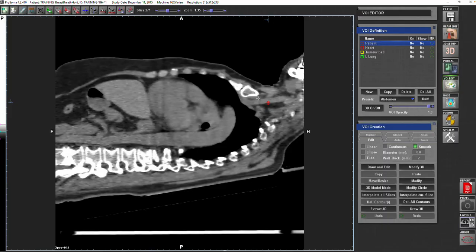So you can have an artery that is superior or cranial, but at the same time posterior because of the sloping nature of the body. That's why the vein in relation to the artery starts caudal, like below, but at the same time it's ventral, and that's the point.